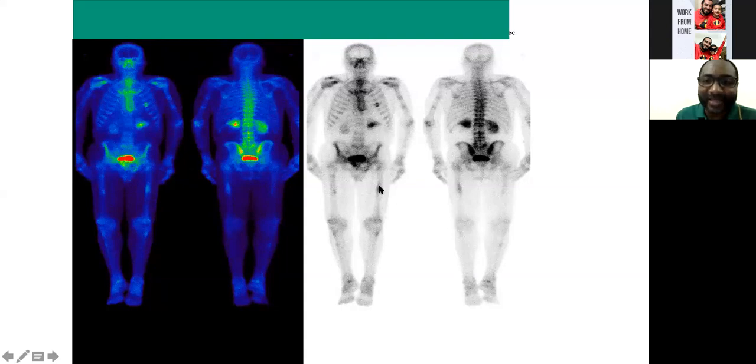This is going with stress fracture, right? No, the stress fracture is oval. This is long, you can see it is not oval. Oval is like this. Let me show you how oval looks. Oval is like this, and it's mainly cortical. Okay. All right.